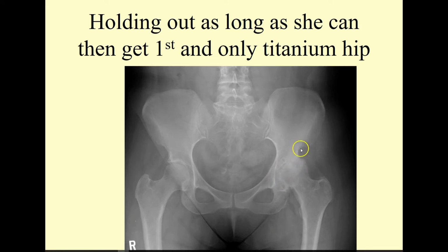Out here, clearly this is an osteophyte off the acetabular side, and this bump right here at the margin of the femur head, osteophyte. And then this depression in this chamber, yes, you're right, subchondral sclerosis. So she's got the total package, and things occur more or less in this manner. Decreased joint space, followed by subchondral sclerosis. If you look at this area here, it's infiltrated with bone density, more so than this side, which is more lucid. So decreased joint space, subchondral sclerosis, marginal osteophytes, 2 locations, and sometimes subchondral cysts.